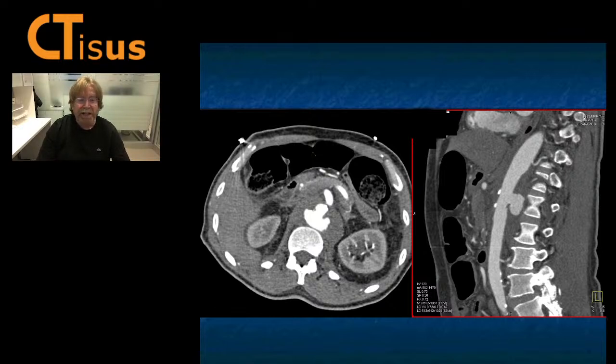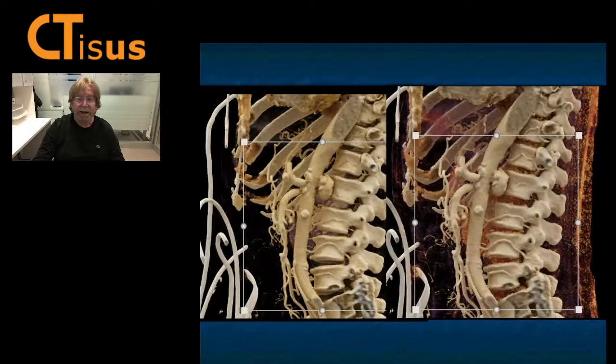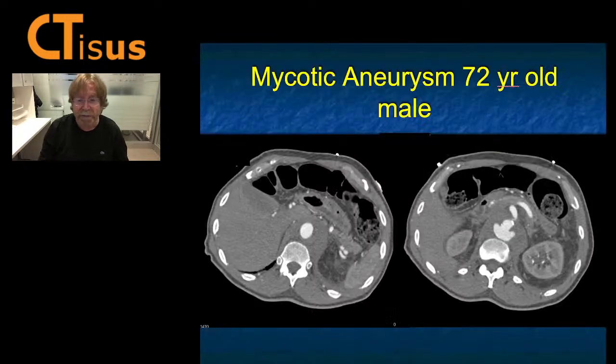It's most classically a mycotic aneurysm. Patients often with septicemia. It's unusual. You can see it on the volume rendering here and see it on the cinematic here. That's a classic outpouching, and the diagnosis is a mycotic aneurysm. Again, Stefan Zimmerman mentioned when we were showing the case yesterday that everyone he's seen has been in this same area with this outpouching, and that's kind of been my experience as well. So a really good case.